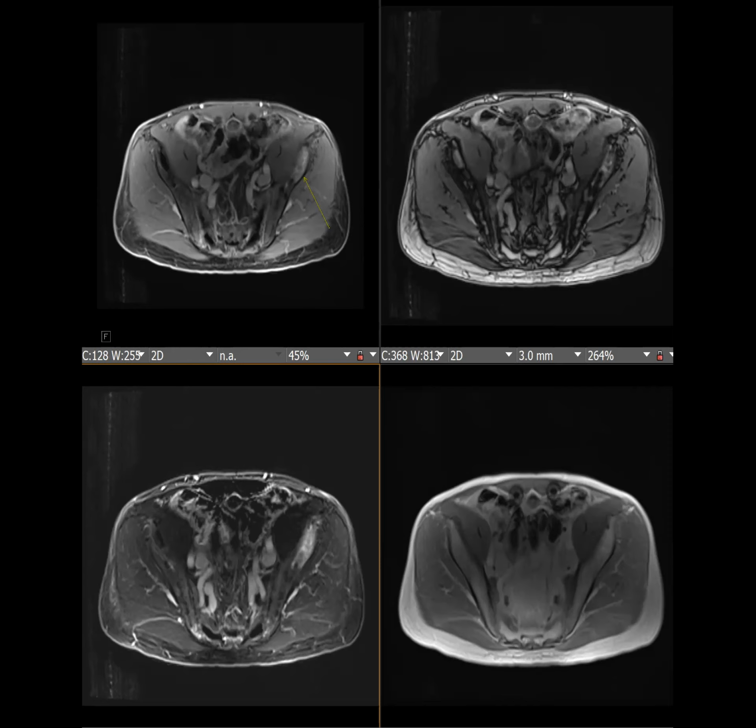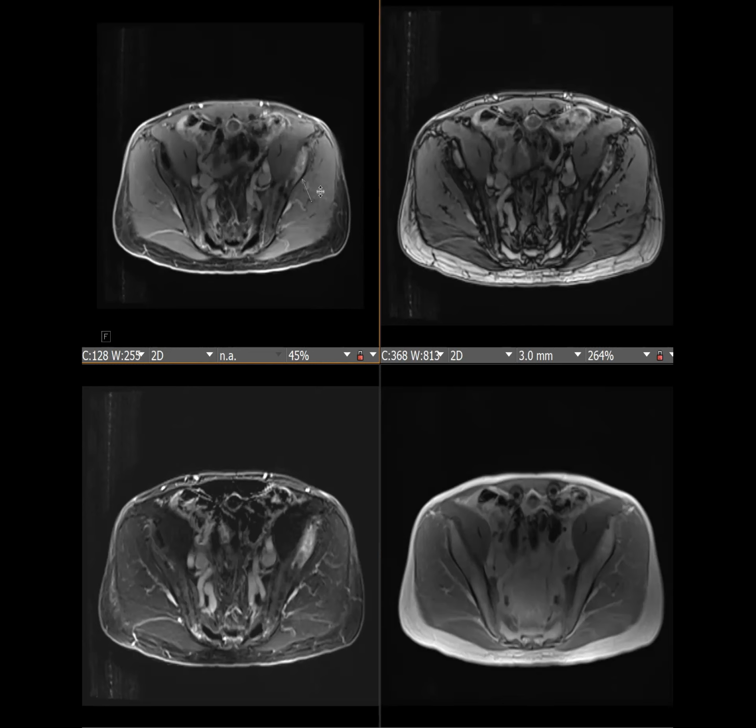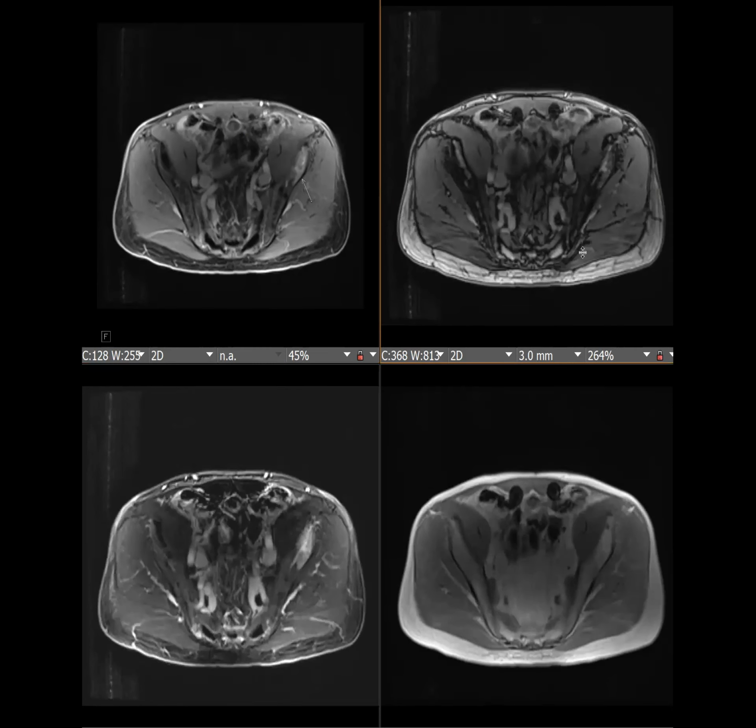Prostate case. There was this gentleman who had prostate cancer, and he had this finding in his osseous structures. The prostate cancer is here, but he has this finding in his bones. The point I wanted to share really quickly with the group was, I can't show the ROI because it gets taken away when I take the patient's information away.